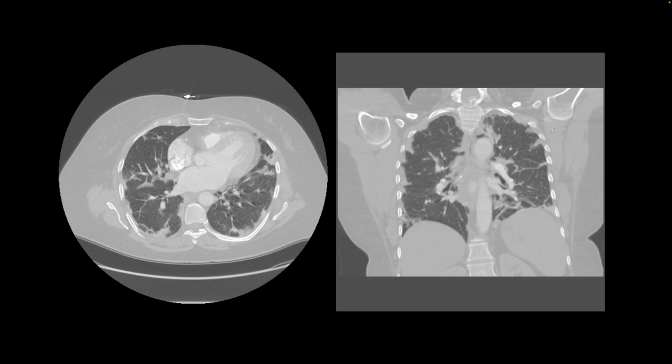This is our next patient, and we used to see these findings during the COVID-19 epidemic a few years ago, but not anymore, where peripherally in both lung fields we find ground glass or infiltrative opacities, right? And this is classic for COVID-19 pneumonia.